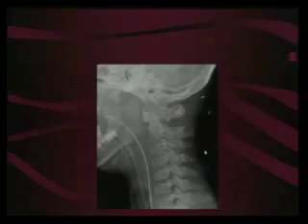Everybody ready for a test? Just in case? Okay. Everybody get up at once. Here's real life. This is what it looks like. This is not the pretty stuff that we had before. Okay. You want to take them? Jared, you're a spine guy. All right. You can have the easy one. We'll save the hard ones for, I know Coulter won't.